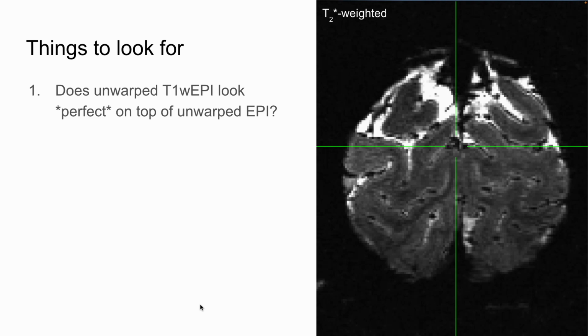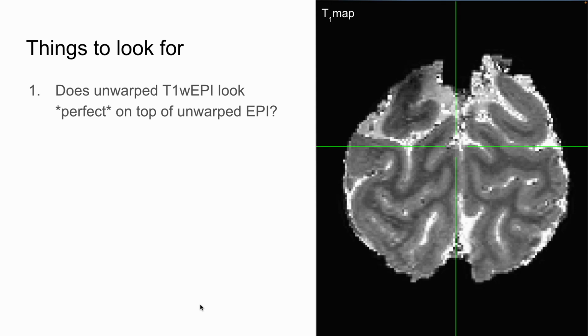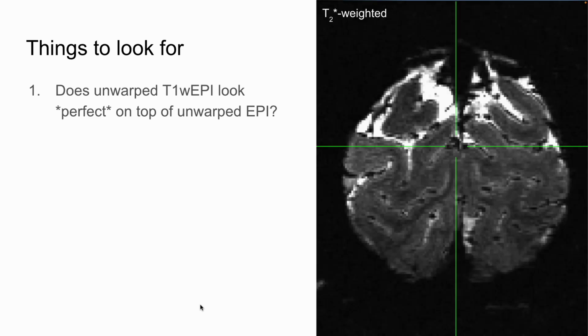This is a coronal section, the back of the brain, so the sagittal sinus is here. This is my enemy. Hate the sagittal sinus. The amount of deoxygenated hemoglobin really perturbs the magnetic field. It really makes the inferior parts of the occipital lobe swing back and forth when it's distorted. And you're also seeing a lot of signal dropout because these are T2 star weighted acquisitions. And so I don't know that I have any business doing analysis of functional data down here.